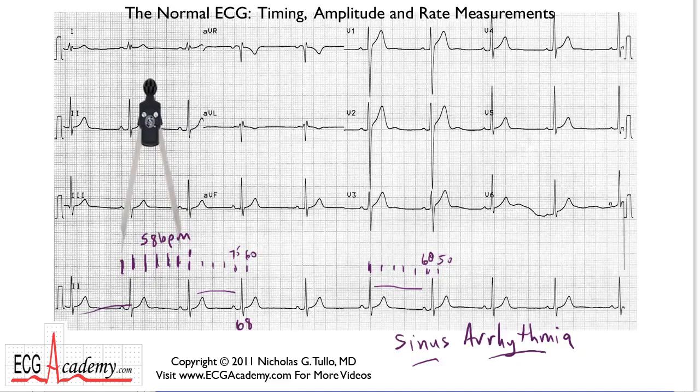The key here is that you really have to look at the whole entire tracing. I always tell people when you're first looking at an ECG, you really have to look at the whole forest. Don't concentrate on the trees. Don't zoom in and look, oh, look at that, that fifth beat over there has a little funny squiggle. I wonder what that is.